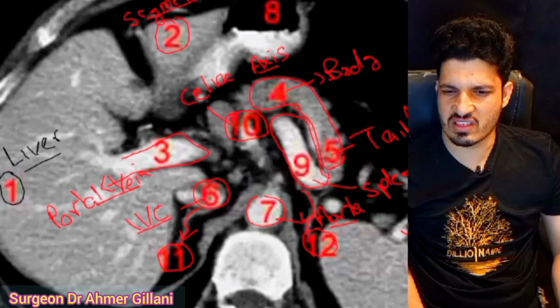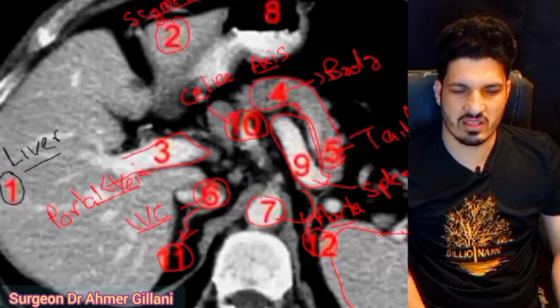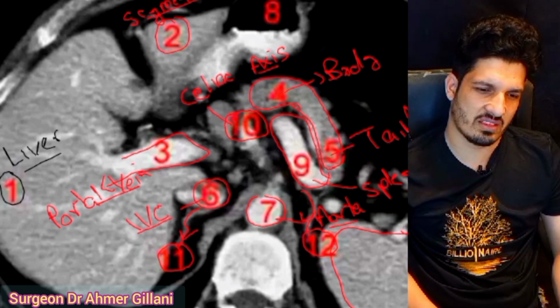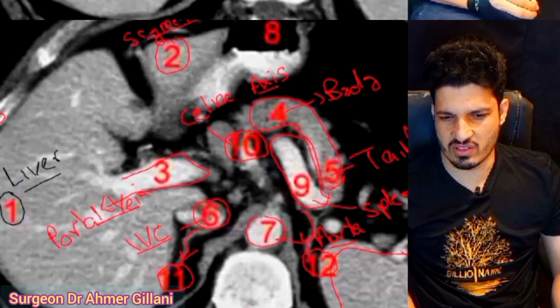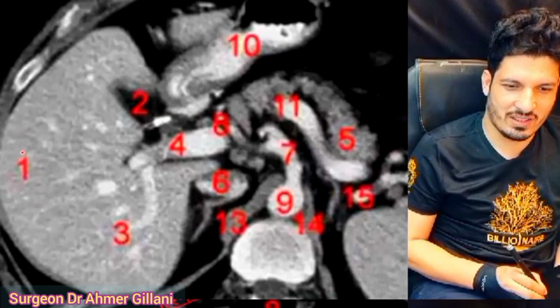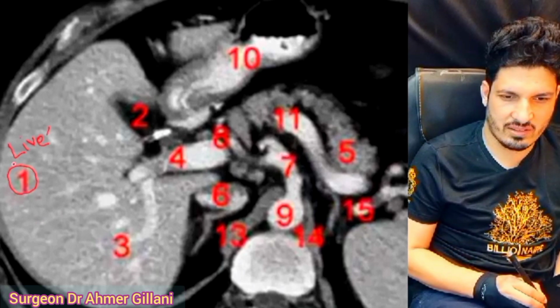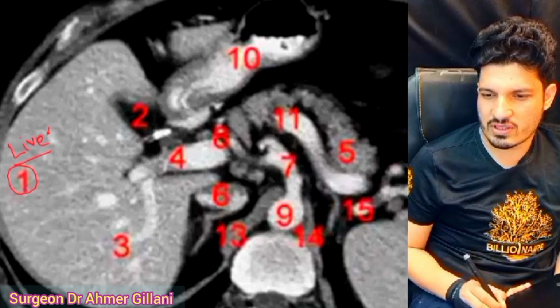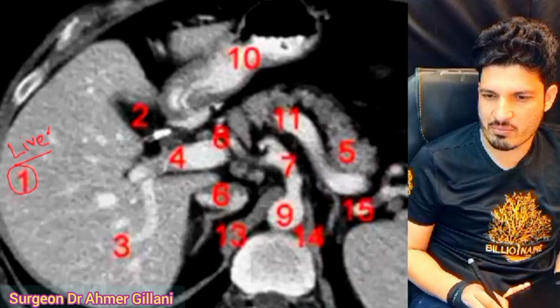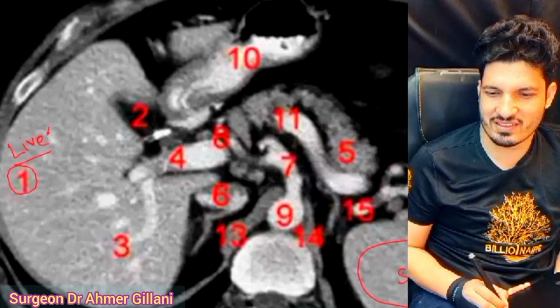This is again this large structure, this is the spleen. So there is no logic to identify this, already I have mentioned it, and these are definitely ribs, again no need to mention. This is the vertebral body. One is definitely liver. Okay. Now the structure number 12, which I am marking now, I think no need to mention this structure. This is spleen.